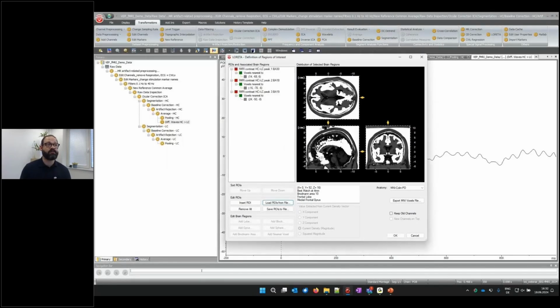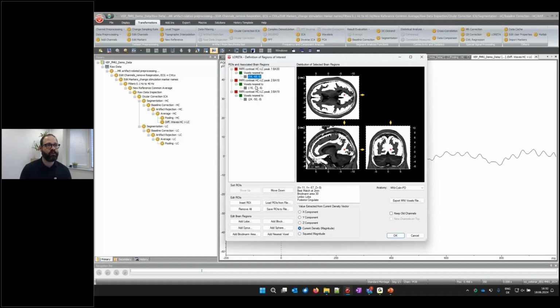So I have defined 3 regions of interest here. And you can see now if I click on them, how this dot is appearing here. And if I click on a different one, it moves somewhere else. So those are single voxels because what I did here is I defined a coordinate that you see here. And I said, give me the voxel nearest to that coordinate. So it's just one voxel. But if you point your attention to here, you see actually what I wrote here, or the coordinate that I selected, and the coordinate that we have here visible in this map, and also where the activity is extracted from, is a different one. And this is now because the source model of LORETA is a different one than of the fMRI data. So it just happens so that this voxel that I got out of my fMRI GLM is not part of this source model. So it jumps over to the next coordinate.